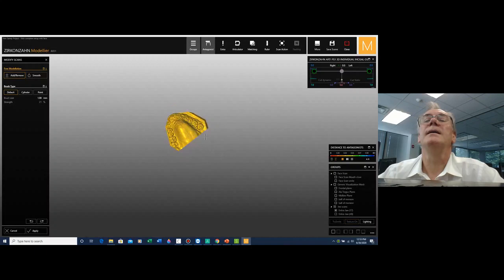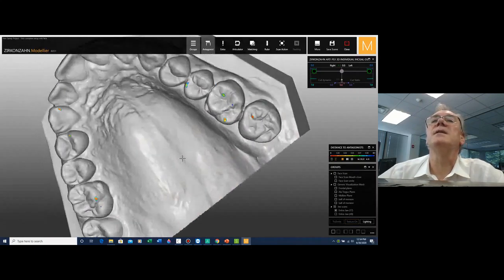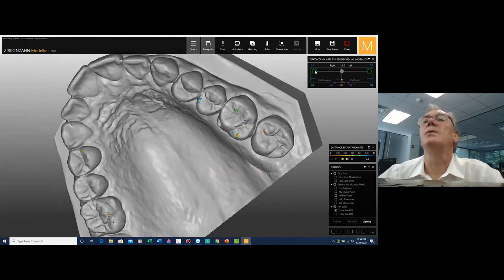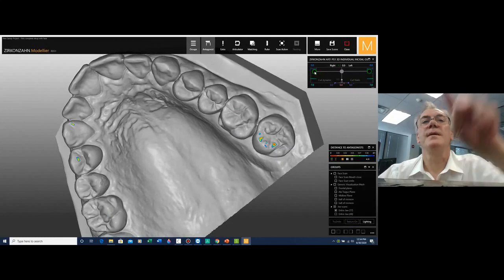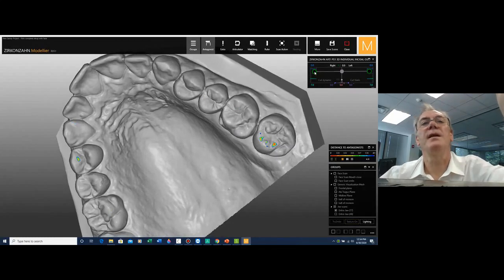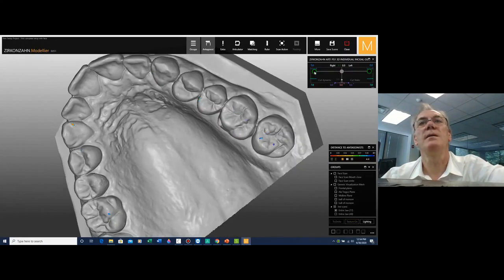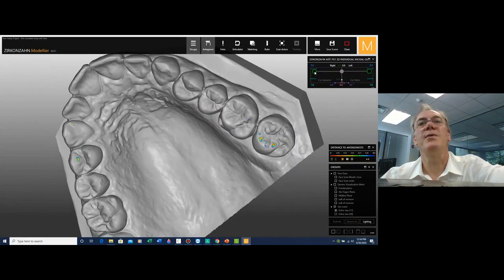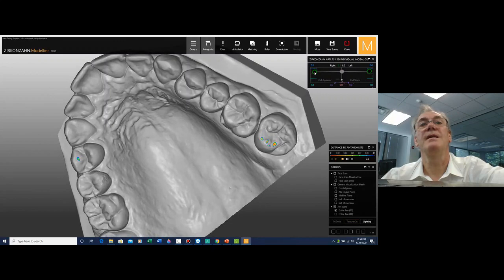So he's back. Let's take a look. I'm going to say okay. And let's see if something has improved. We go 1, less than before, 2. The canine is still carrying the contact. 3, it loses and the premolar starts taking the contact. So you see how the contacts change just by eliminating something down on the posterior area. Look at this. 1, 2. The premolar starts taking the contact. This contact was not there before. 5, 6, 7, 8.